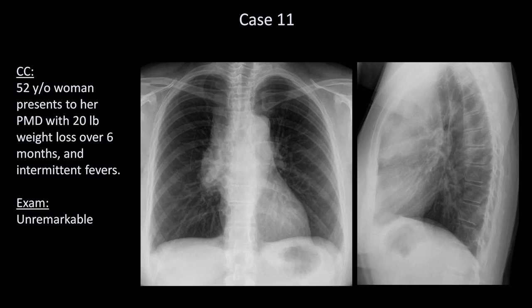In this X-ray, there is a large mid-thoracic mass that appears just to the right of midline. Where exactly is that mass? The clue is actually on the lateral film. Look here. What's not present?